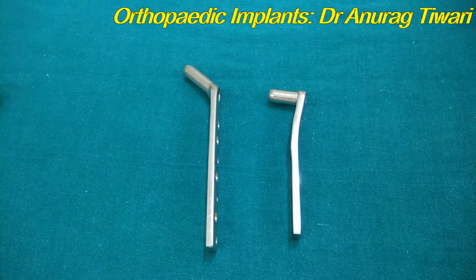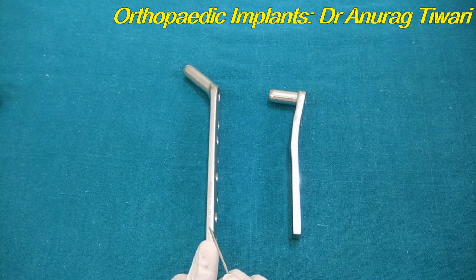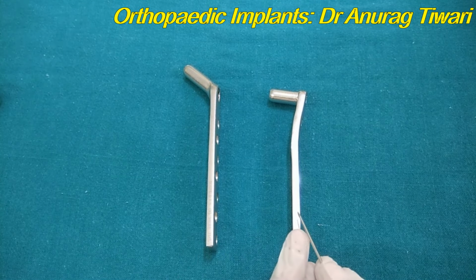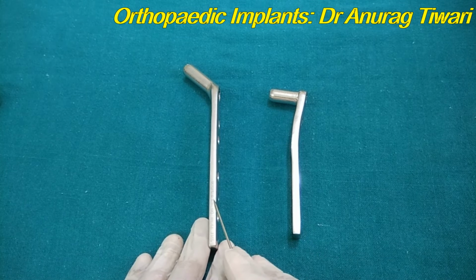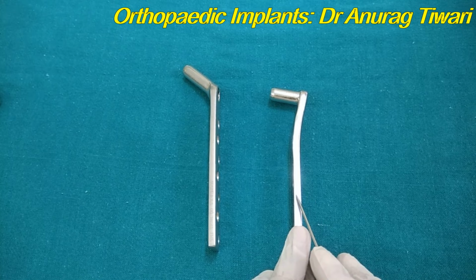This is actually a barrel plate, or you can say a sliding hip screw plate, and this is the dynamic condylar screw plate. So this is DHS and this is DCS. The main indication is intertrochanteric fracture. The DHS was mainly made for the fixation of intertrochanteric fractures, whereas the DCS was made initially for the intercondylar femur, the distal femur intercondylar part fixation.